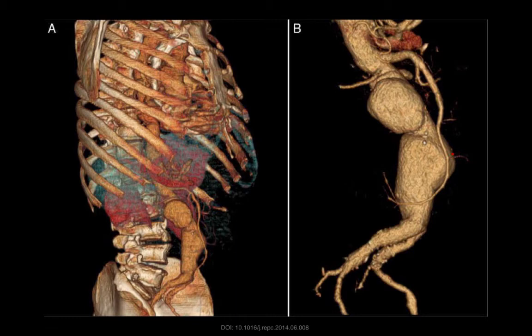I'll bet you down the road we are going to have more and more use of 3D ultrasound as computing power gets more and more portable. We're going to start to see 3D reconstructions, right? You put your ultrasound probe down, and on your screen, poof, right? This is nowhere near technology that's available today, but I'm guessing that it won't be too far off when we really start to see these really amazing 3D reconstructions that are available on point-of-care platforms.